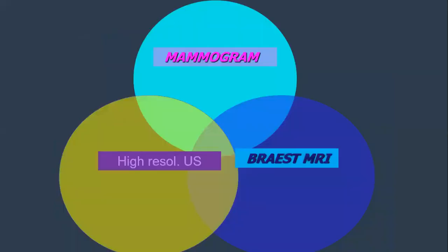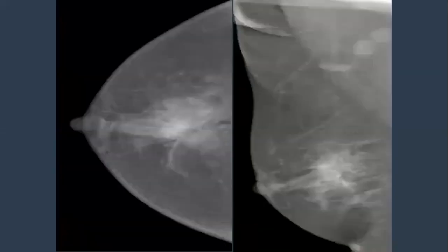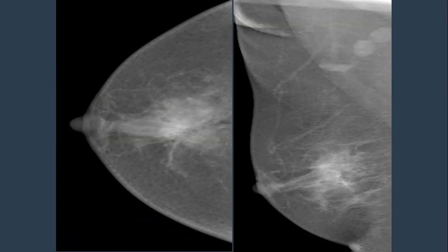Okay. And what about this? Any volunteer? Yalla, let us go quickly. Irregular. There is architecture, yes.